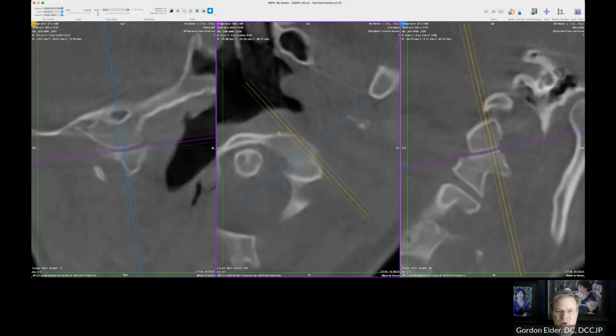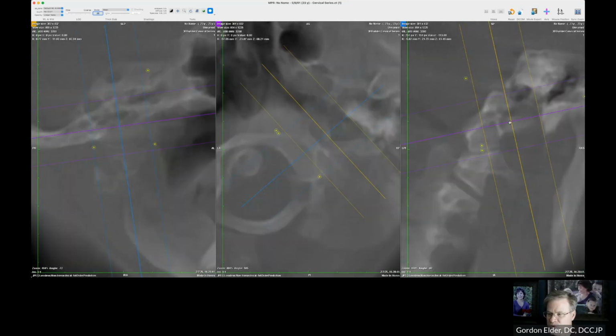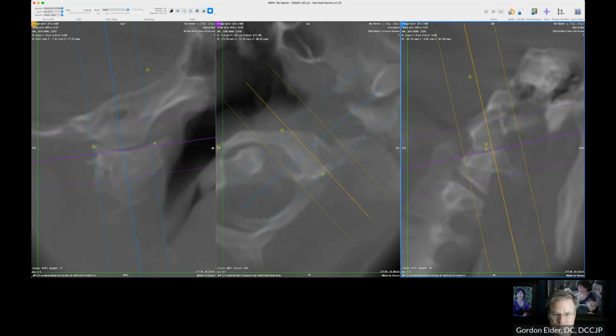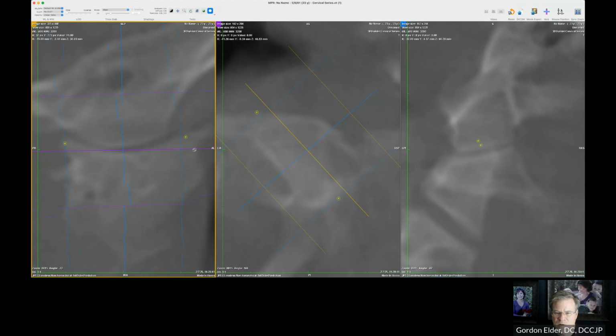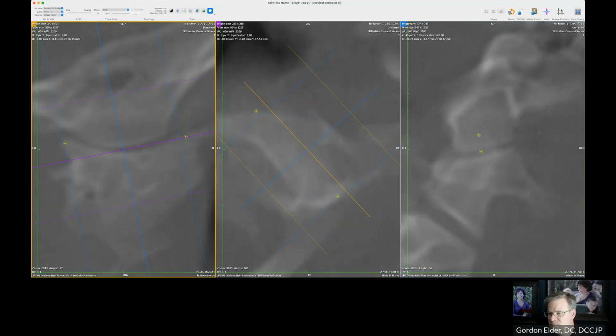So again, remember this was a 3 millimeter, and ideally we should be looking at the whole joint. Dr. Blair initially, evidently, was shooting his x-rays straight down the atlas sagittal AP plane line. The problem is the orbit kept getting in the way, and so they started going through the maxillary sinus. That was one of Dr. Muncie's suggestions for Dr. Blair. Okay. So, matter of judgment, you could mark that as a small underlap.